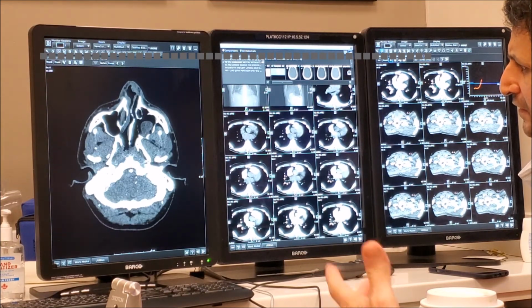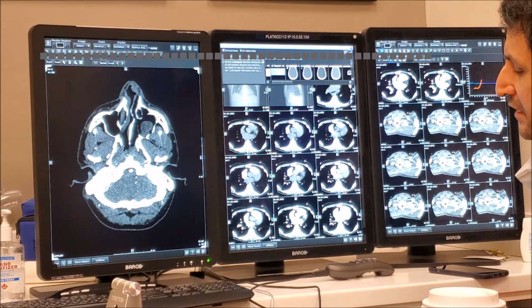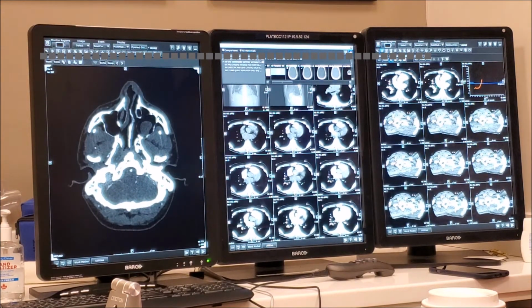So when you're trying to figure out if there's a carotid canal, what are you trying to do? I'm trying to see if this ICA stenosis has been something chronic, which means that the carotid canal also is different in size, which it is. Okay, so that's a very good example. So you have one big foramen and one small foramen. Does that tell you anything? Yes, so the artery on the left side has had 30 years to carve the bone, but on the right side it had carved a smaller hole.